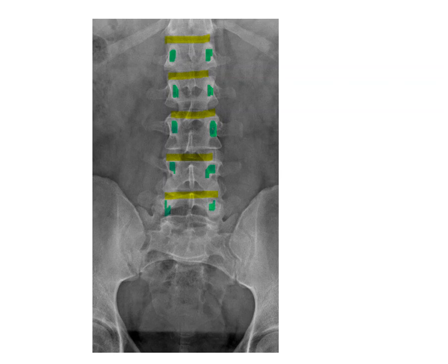All right, now let's look for spinous processes. We look for the spinous processes to be centered down the vertebral body. So we would say spinous processes are centered down the vertebral body. So when we talk about something being centered or equidistant, we're talking about the fact that the patient's body was straight on the table with no rotation. They're in a true anatomical position, lying flat on the table.